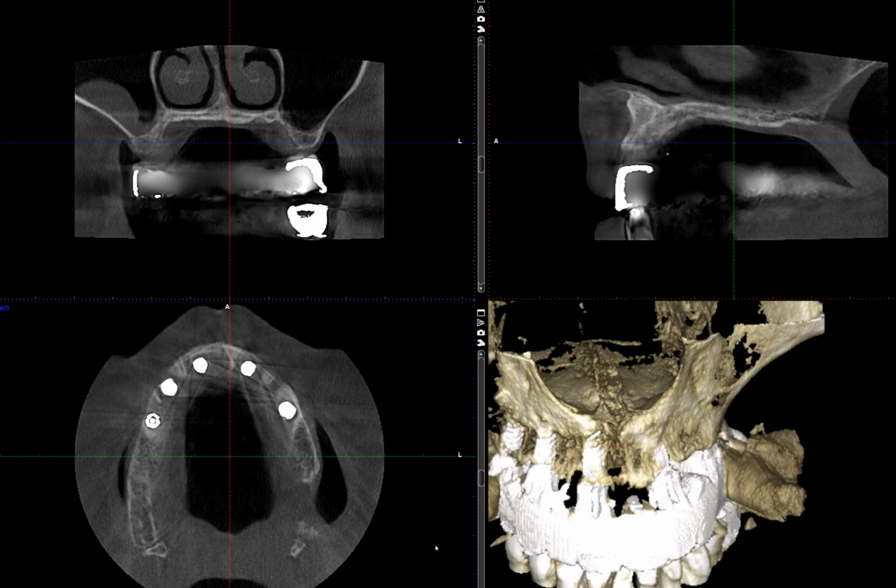Hello everyone, this is Dr. Kim. In today's video, we're going to take a look at an example of mucous retention pseudocyst.